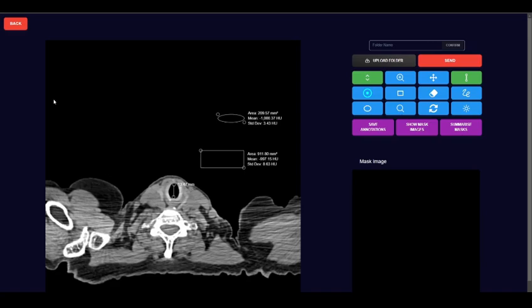So the scale for the DICOM image is already taken. Now, sometimes you might find it difficult to actually see the distance value here. So what you can do is disable the marking here, get your mouse over the value stated, and you can just grab it and take it to another area where you can actually see it. You can do the same thing for other annotations made, like this rectangle or ellipse. So you can just grab it and pull it away. But you can also grab the annotation itself, though it's best not to do it because you can end up moving it like this, which is something we do not want.